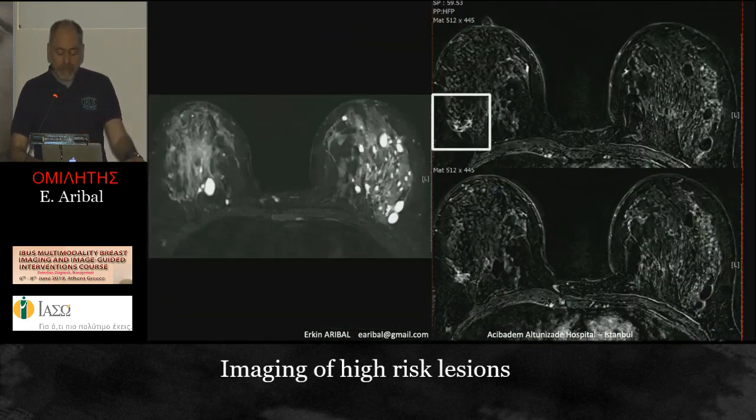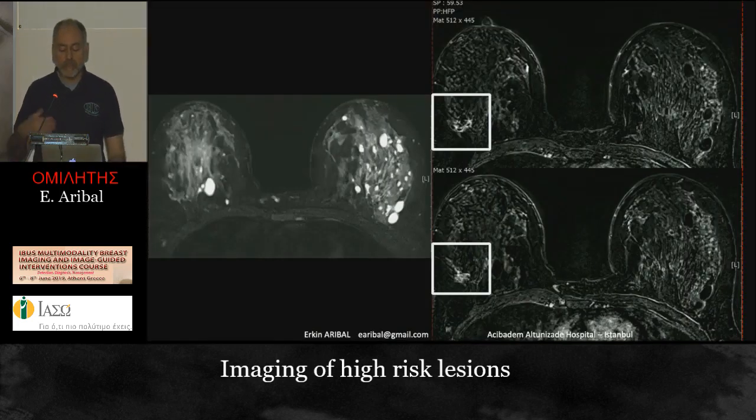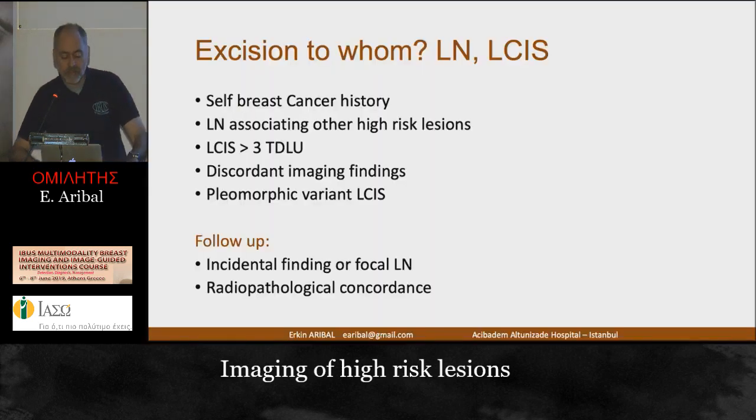Here on MRI, it's the same thing. You can call it a non-mass enhancement or a small mass. And when you receive an LCIS result with this lesion, the result is not sufficient. So you should do the excision in lesions like that.